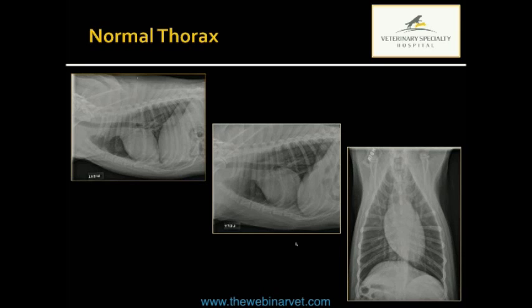White already went through evaluation of the abdomen with you, so with the same level of detail and thoroughness, even though you have a limited portion of the abdomen, you want to do the same thing: serosal detail, organ by organ, whatever you have. You want to make sure you evaluate that.